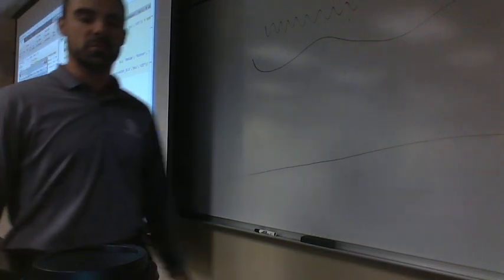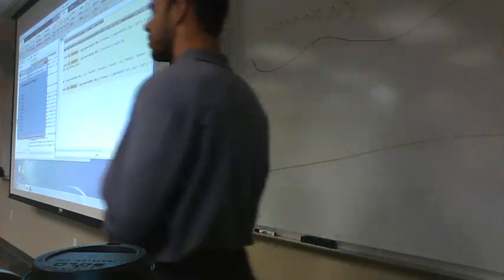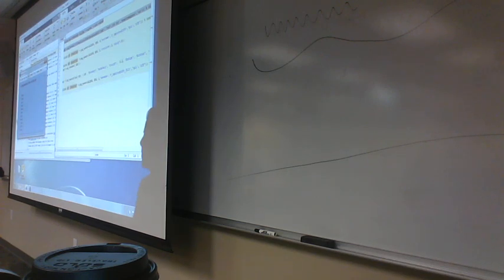So that's not going to change much of how the data looks when we plot the channel data or scroll it, but it will change the size of our file types. Okay, that actually brings us to a good point about file types.